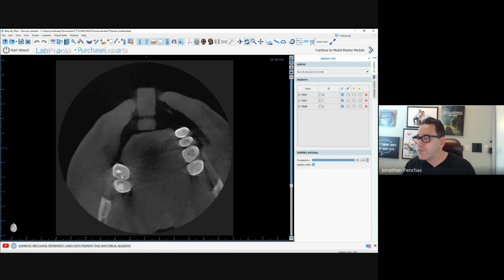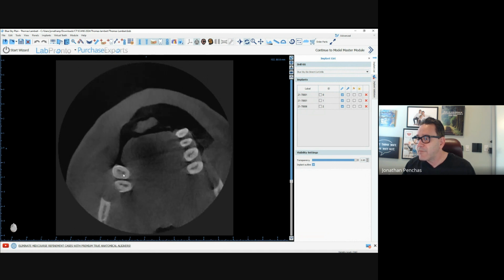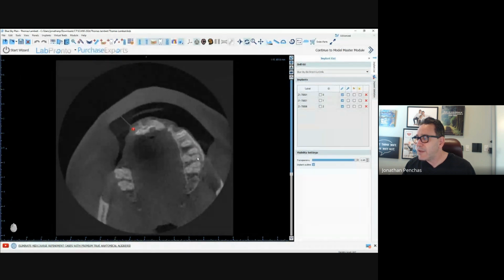But on the other tooth right here, on the other molars on the other side, I can't see it. I could just see the canals and I can see how they end. And of course, you could see here 1, 2, and 3, but there's an MB2 here. Right here. 1, 2, 3, and 4. So very helpful to actually look.